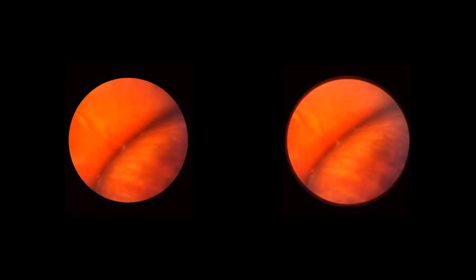This is the fellow eye of the previous patient, showing 3 tiny delicate tufts with parts of the tufts avulsed by vitreous traction. These lesions are symmetrically located in the fellow eye, as compared to the lesion in the previous 2 slides.